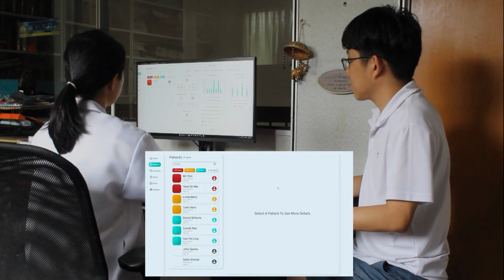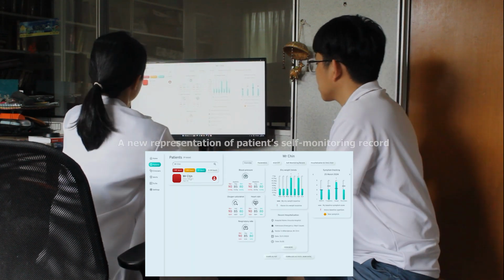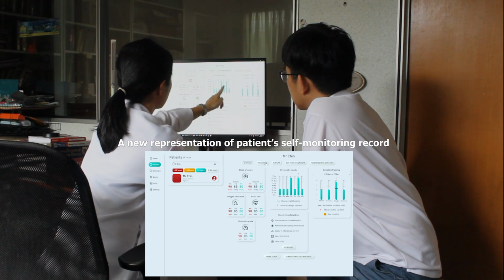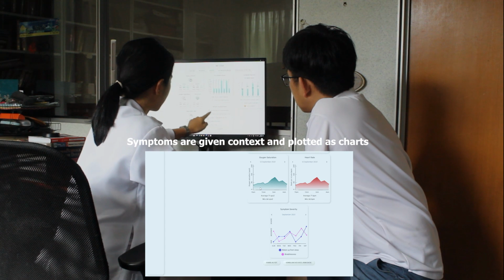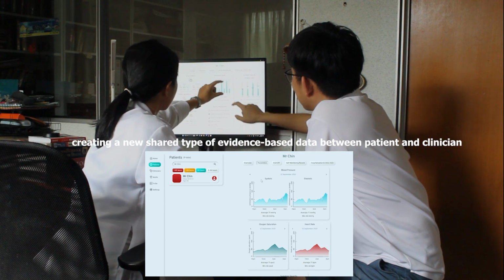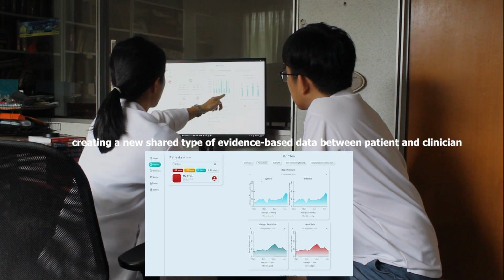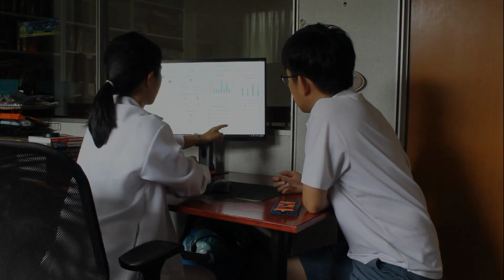The unique feature of our clinician web app is the intelligent agents that automatically sorts alert data of patients' symptom severity trends. It personalizes the data visualization according to roles and expertise of physicians in the management of the heart failure patients. Clinicians can remotely view patients' individualized self-monitoring records and call patients for an earlier schedule if needed.